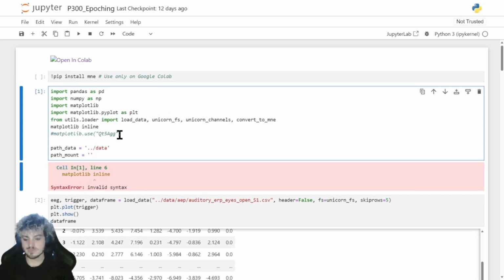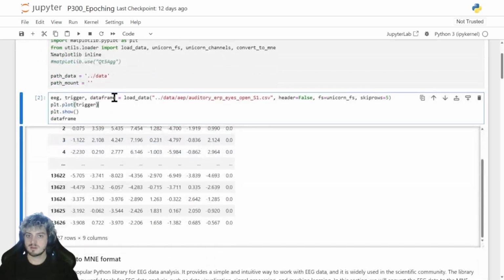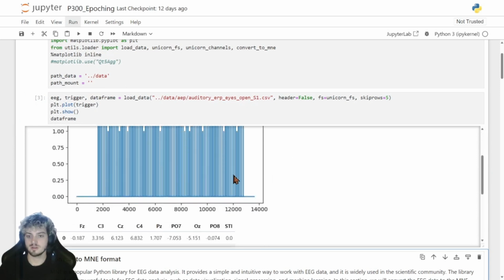Yes, I forgot the percentage symbol. There it is. Then it's basically the same, but the plots are now part of the output of the Jupyter notebook, so you cannot interact with them anymore.